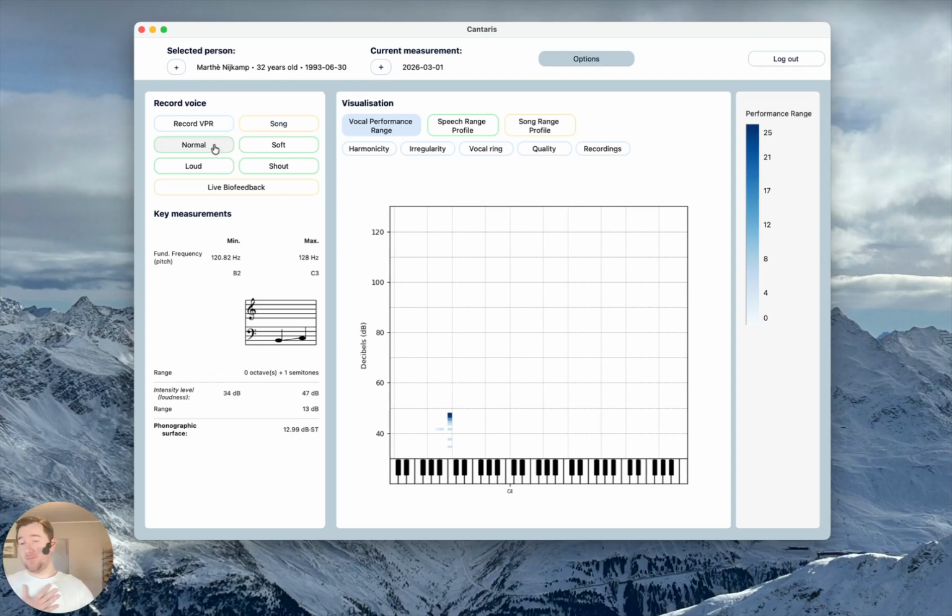So in my way of working, I can just click this button and let's just talk a little bit, talk something about the weekend, for example, and let's see what my voice has done during this recording when I end it and click right now.